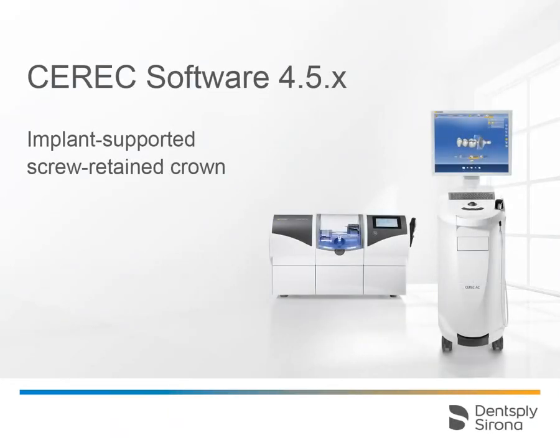Welcome to this video tutorial on the topic of implant-supported screw-retained crowns. This video features an overview of the entire production process. Further tutorials are available on our learning platform, with detailed information on the individual steps and phases.